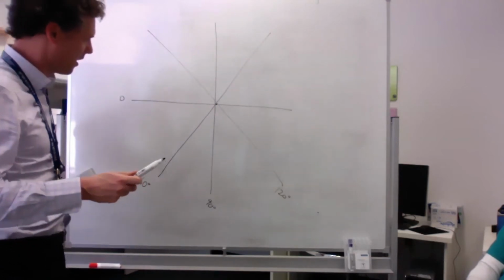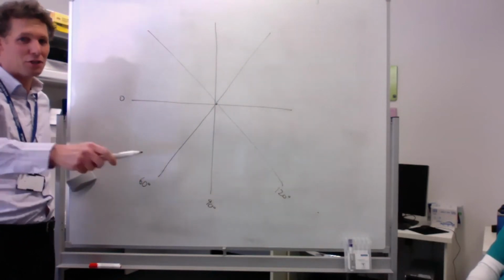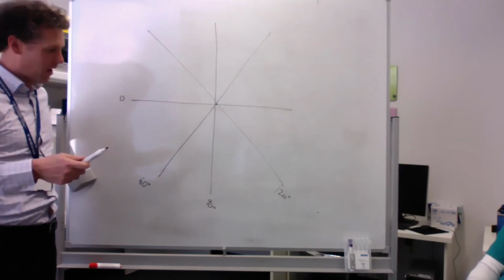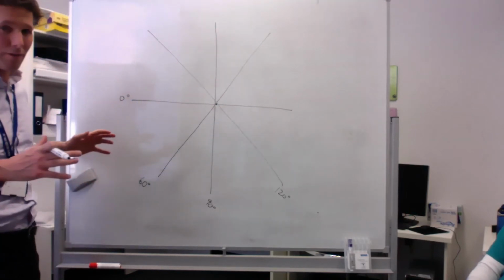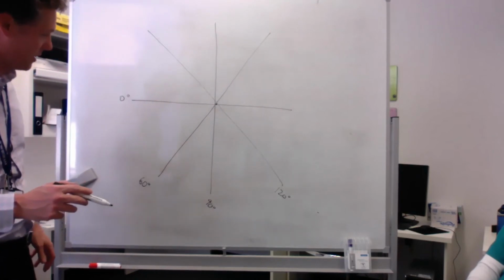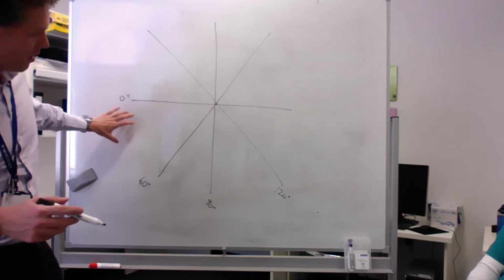You're right. I find this really hard, and I think it'd be a great question to sit in the exam, to ask you to draw it. If you're doing it on TOE, it's a really good way to try and figure out. A really easy way is I just think about 0 and 90 degrees, and we'll show you a case in just a second.